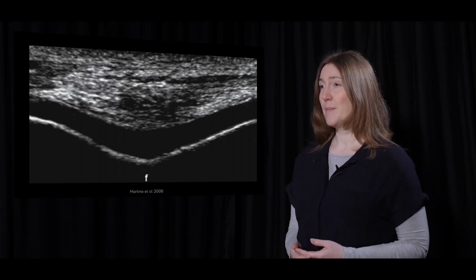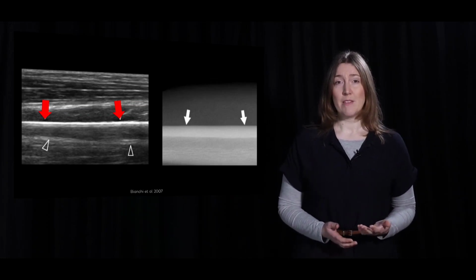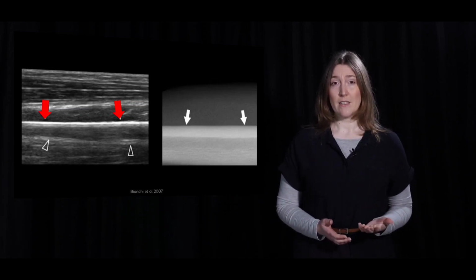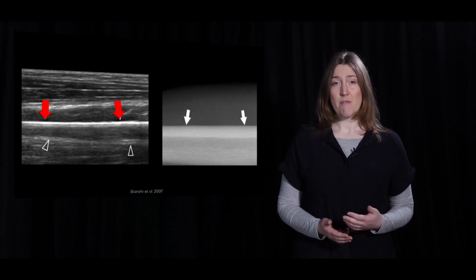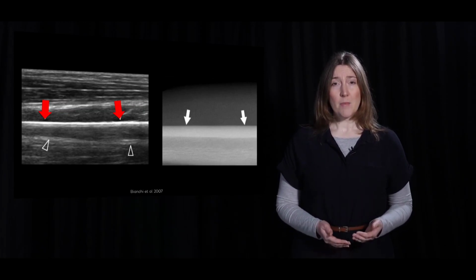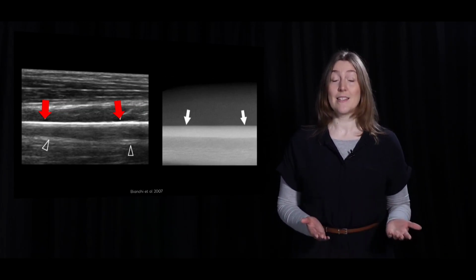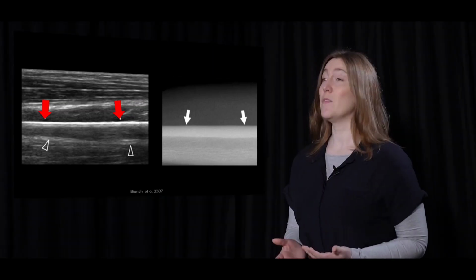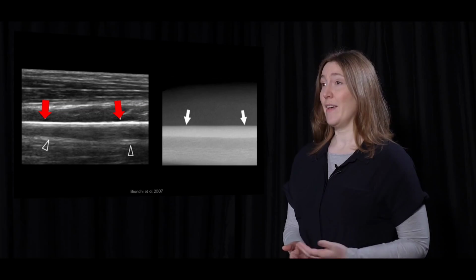or luxation. In the left image, you can see the ultrasound appearance of the normal diaphysis of the radius. Please note that the red arrows are indicating the hyperechoic lining of the bone. But underneath this hyperechoic lining, we can see tissue instead of the to-be-expected acoustic shadow. This is a pitfall. In this example, you're looking at tissue which is actually not there.